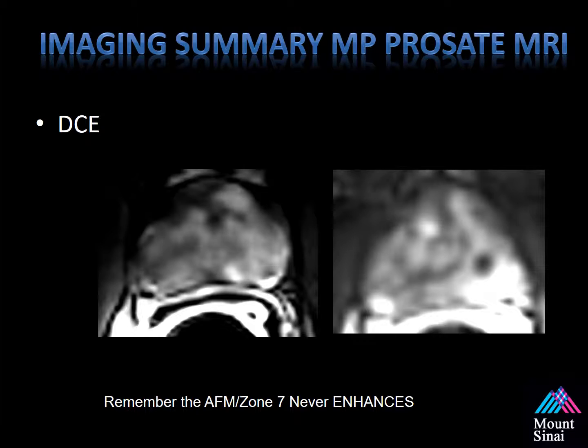DCE, dynamic contrast enhanced MRI. The anterior fibromuscular stroma, or the zone 7, never enhances. If it is enhancing, an early enhancement, most likely this is prostate cancer. So it's important when you review your images to look at this area specifically.